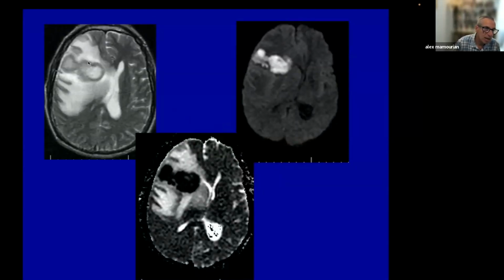You can see this lesion has a relatively dark margin on the T2 weighted scan, quite a bit of T2 prolongation, a lot of mass effect as a result of all this edema, likely vasogenic edema. Notice that the central portion of the lesion is uniformly high signal intensity, even into these little subtle areas here, these very fine areas of high signal intensity on the diffusion scan that shows marked low signal intensity on the ADC map. This is a typical appearance of a brain abscess. So again, showing you the difference between the way diffusion looks in cases of neoplasm, high-grade neoplasm, and brain abscess.